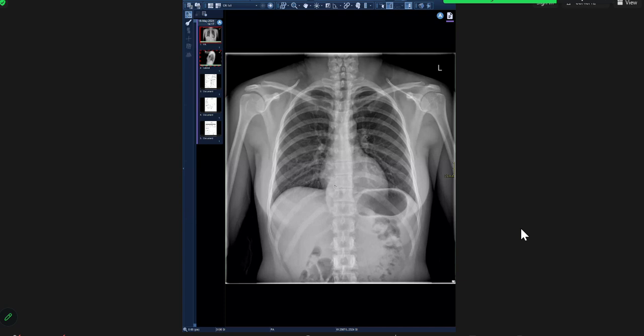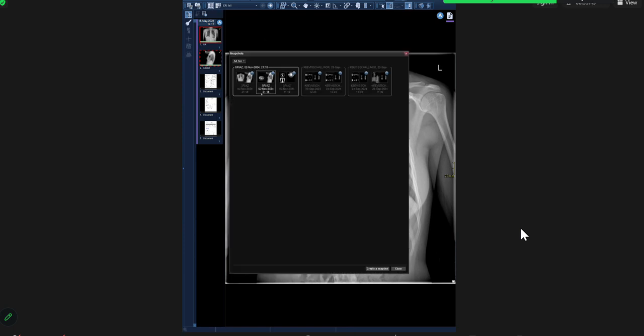So you don't see a fracture here, because it could be a hematoma. Yes, ma'am. You said that you didn't think that it was an abscess, but you cannot rule that out. Yes, ma'am. So then you said it could be a posterior mediastinal mass. Good. And then you said the lungs are clear. So that's it. So what do you want to do next? Ma'am, on the lateral chest X-ray, I cannot see anything, so I will go for CT.